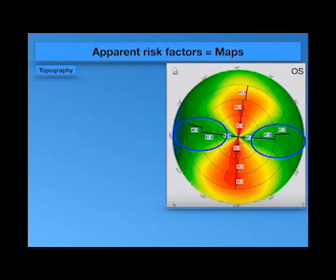The second point is the Q value. You will find the Q value on the right side, in the bar of the printout from the Pentacam, either on the right or the left with the data of the patient. You will check the Q value. I will show a paper about it later in the coming slides.